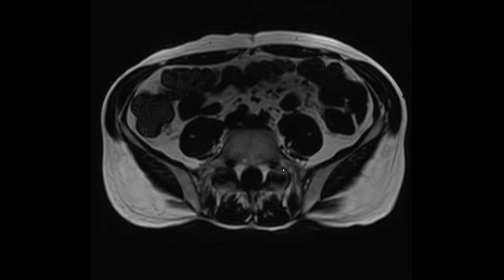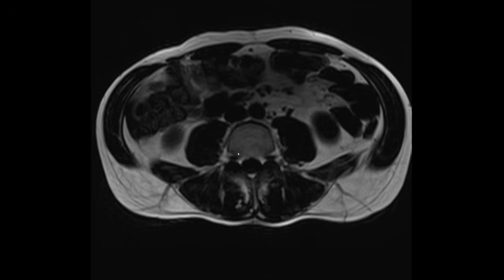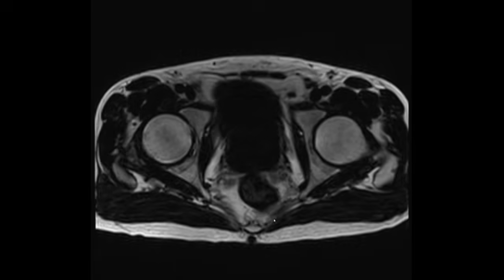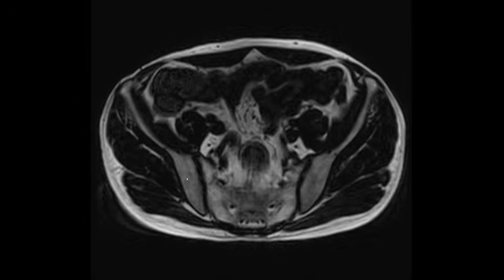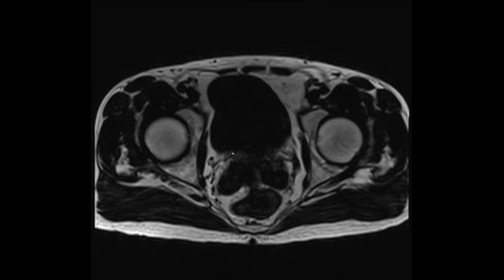Lastly, I will also look at any wide field of view T1 weighted images that are non-fat-sat, or in this case, this is a fat-only image acquired by the Dixon method, and I'm looking at the bones to see if there are any marrow replacing lesions. So this is all fatty marrow, as we'd expect. And we want to see if in any of the bones there are lesions that might be suspicious for a marrow replacing lesion, in the setting of a prostate cancer, of course, looking for metastases. And that's pretty much it for an abbreviated approach to prostate MRI.